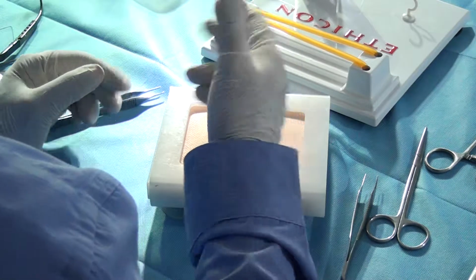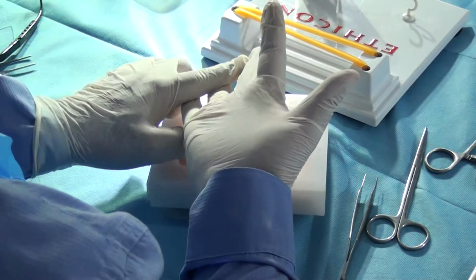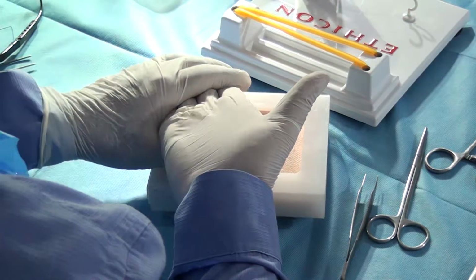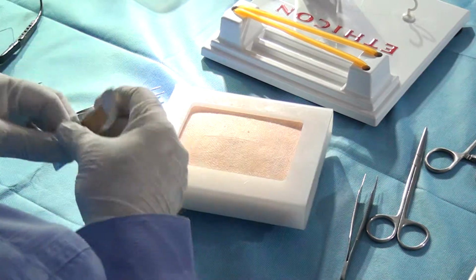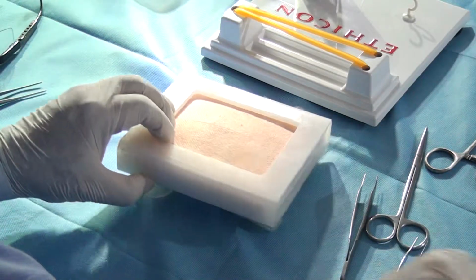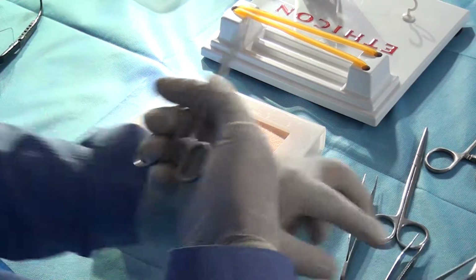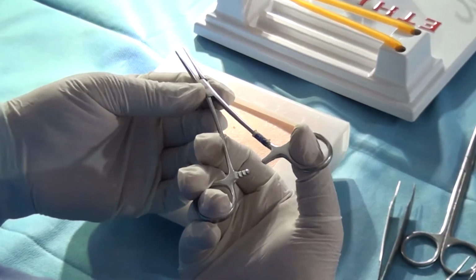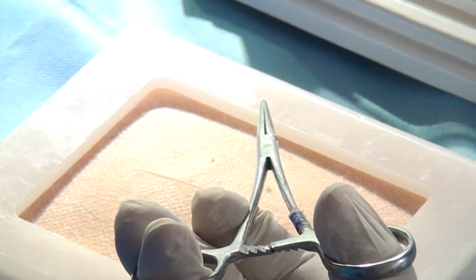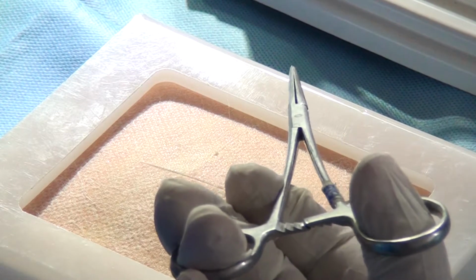So you've taken care of knife, scissors. I've shown you the straight scissors, curved scissors, pot scissors, that is a bonus. We have taken care of forceps. Now we move on to the next instrument, which is the workhorse of surgery. You will use it today, and it has been given many names: hemostat, or an artery forceps, or a clip, depending upon where you live. It's a clip in the US, hemostat in the UK, and artery forceps in Asia. They all mean the same.